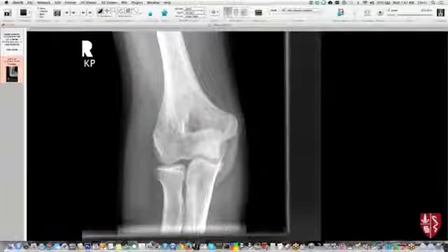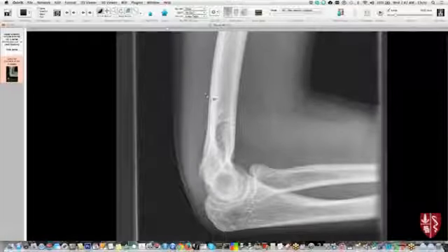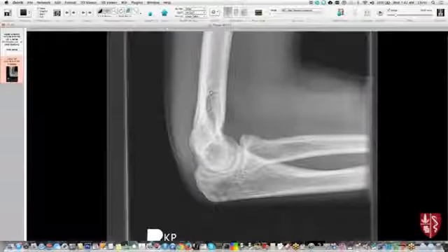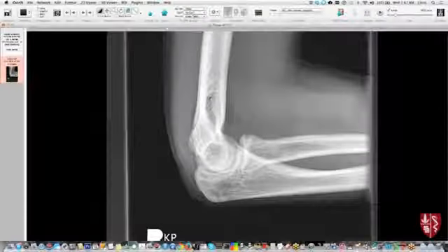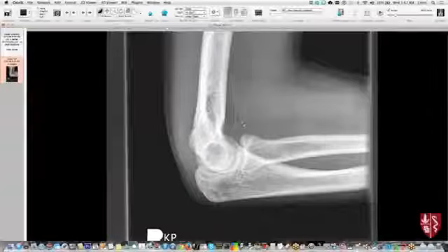If we look at this example, this lateral elbow, it's a fairly young patient, but if you look closely, and I'll try to be careful about window leveling things here, I think hopefully you can all tell that this patient has an effusion in the elbow joint. And so anteriorly, there's this lucency that's the anterior fat pad that's kind of bulging out.